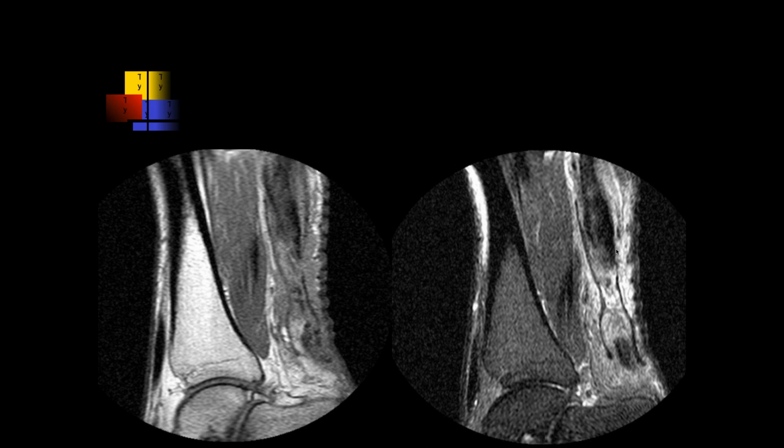So what did John tell you about using the plantaris to encircle the Achilles tendon? Okay, so this must be a case where they encircled the plantaris around the Achilles, but it doesn't attach to the calcaneus, which they call the collagen wrap. It doesn't have to be the plantaris; you could also use other structures.